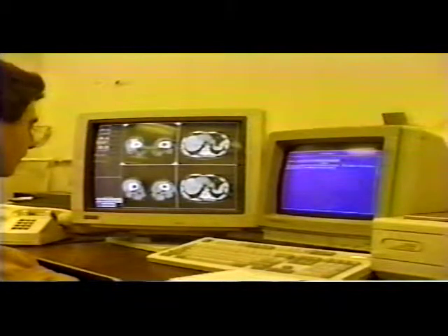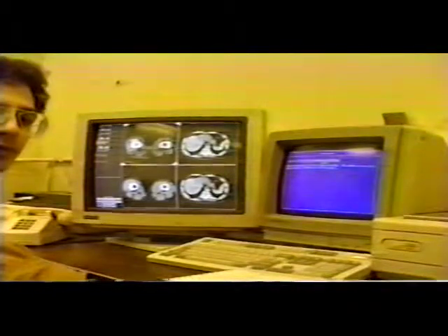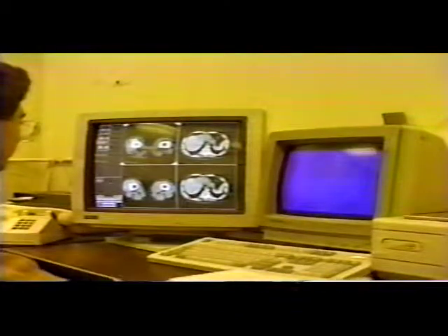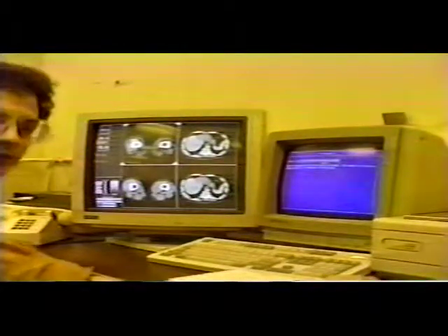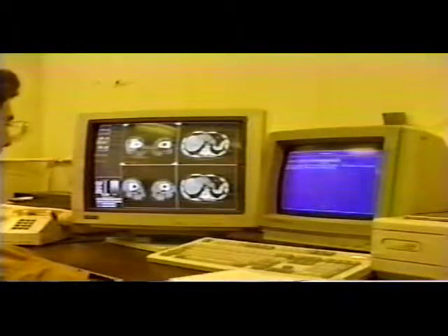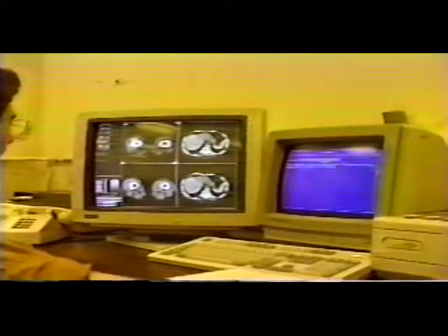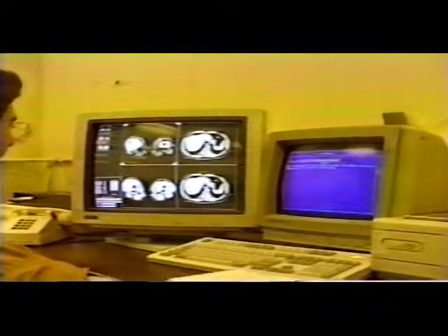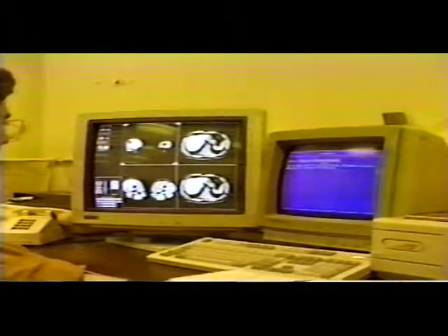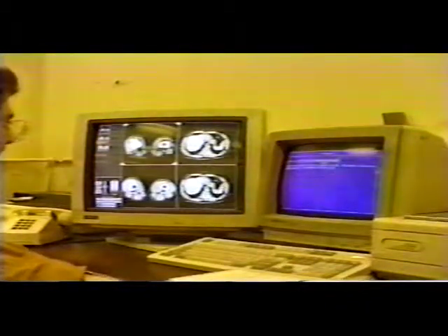The top row of buttons are radio buttons that control what's in this region, like push buttons on an automobile radio. This selects the holding area, that's something in the holding area. The second button selects the contrast control, and we can adjust the max and the min. They're sliders that can simply be moved up and down. If we get a contrast that we like, we could say OK. Adjust the holding area, the contrast again, and I can put it back the way it was. And that probably looks a little bit better to you.